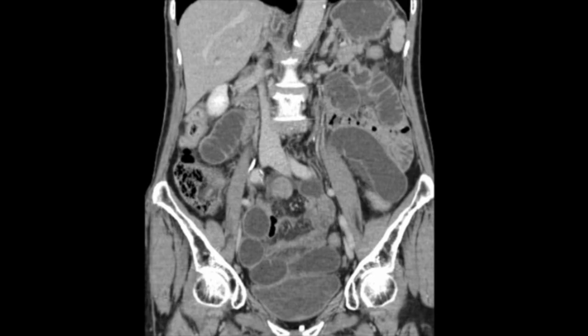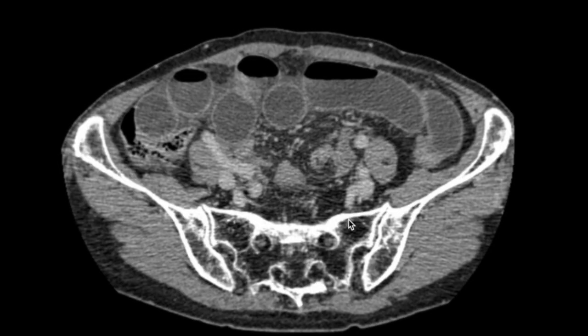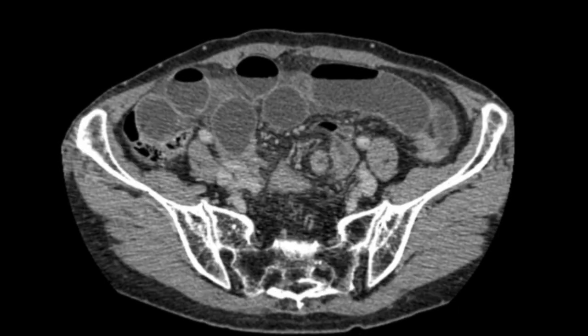If the small intestine is stuck to the abdominal wall or another organ, that might be visible. But there are membranes and fibrous bands that don't appear on imaging. The bowel might adhere to them as well. Rather than identifying these connections on images, at best you can infer something like, given the anatomy, it's probably adhered to that structure around here. You only learn the actual answer during surgery. But that level of detail isn't crucial. What's important from the imaging is to identify the obstruction site and evaluate for a closed loop or ischemia. If you can do that, you've nailed it.